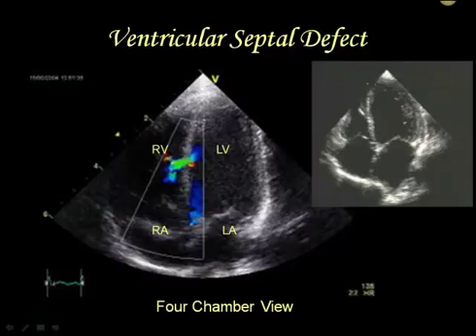Okay, there's the VSD with sonography. Now, this is normal, and you can see there again is a reasonably nice intact ventricular septum. In this case, there's a hole there. The areas there that you see in blue is really the way sonography can record Doppler.